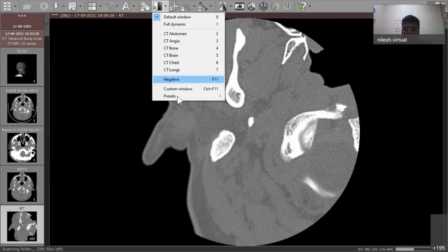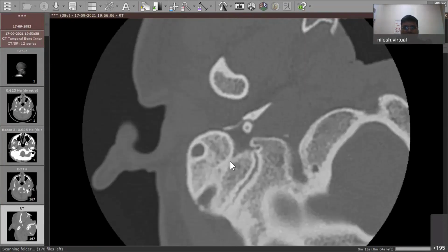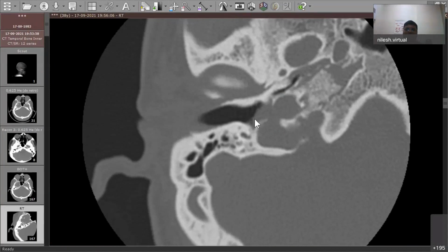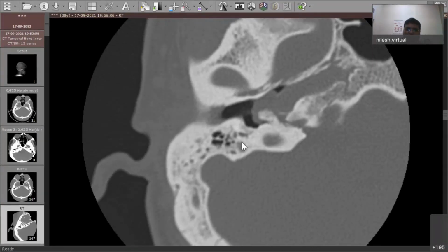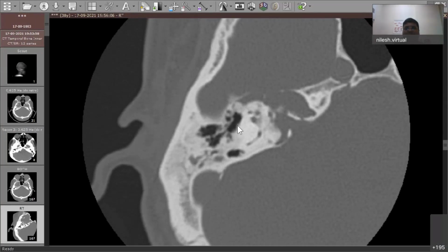To see the middle ear, you come down from up, and you are seeing in the middle ear this much mass only. Now it looks very limited to the middle ear, but when you go through all the temporal bone, you can make out that this lesion has entirely made a mess in the temporal bone. Everything has become a mess. You cannot identify a single structure here.